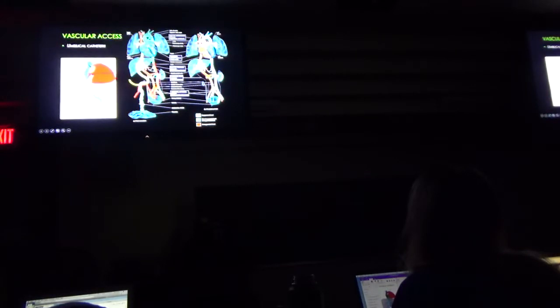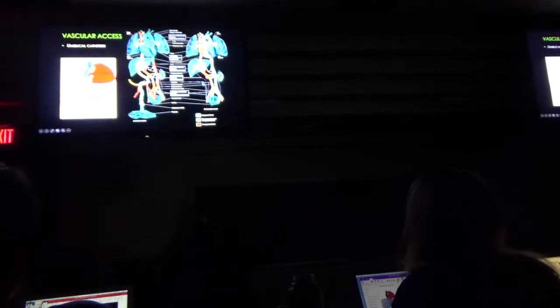So, just by stressing, this shows you all the different variants of the lines once it's being fed. This one here, again, this shows you where it enters the belly. Obviously, this is representing the placenta, and there's the cord itself. So you're starting where the cord was cut. The umbilical arteries go way down before they go up, and then the umbilical vein, again, goes down a little bit, but not as much as the artery, and then goes through the hepatic portal area.